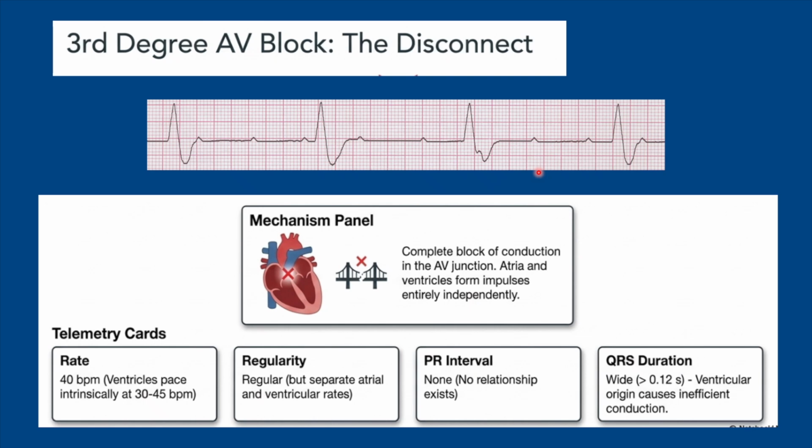We mentioned previously that you will find one P wave per QRS complex. But if you look here, you will find that the P waves are coming at fixed intervals because the atria are working regularly, but actually they will come at different places in relation to the QRS complex.